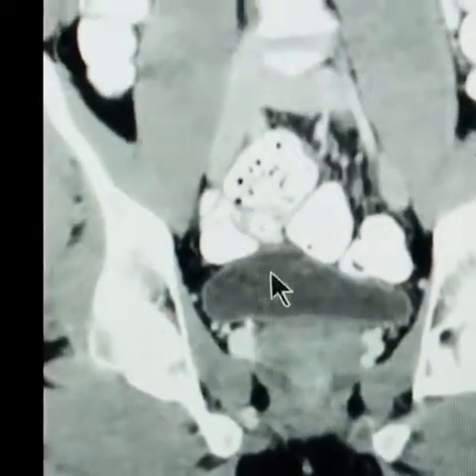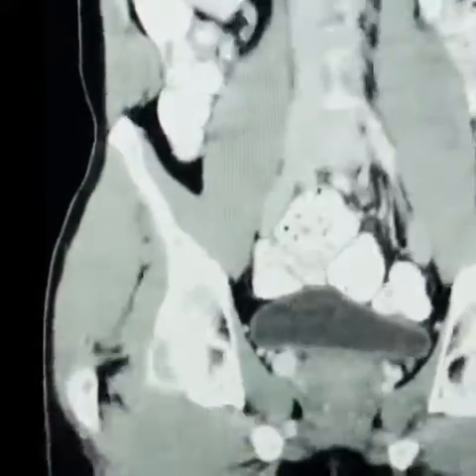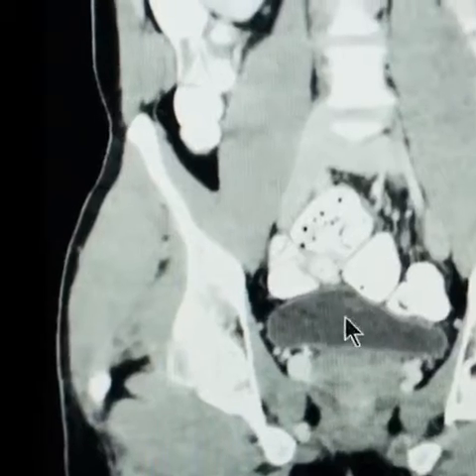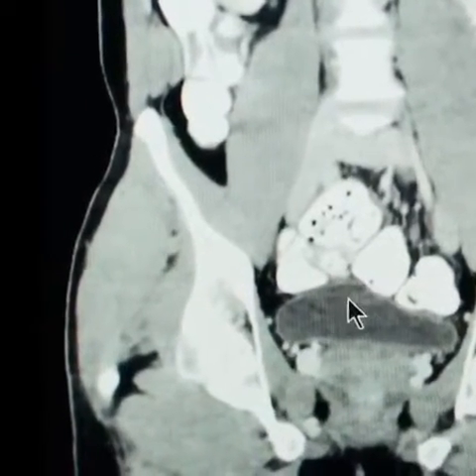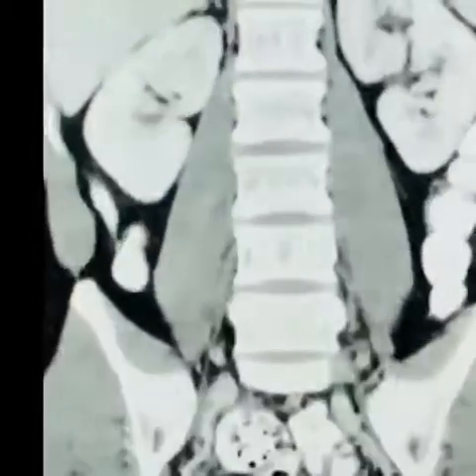Now look at this down here. This is the bladder. And the bladder, of course, is filled with urine, which is fluid. And it's that color. So that color looks like this color, right? So that is fluid. And this fluid is normal in the bladder. But this fluid up here is abnormal. Now that's not any issue. Normally people do have kidney cysts that are incidental findings.